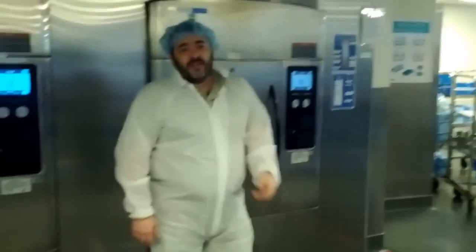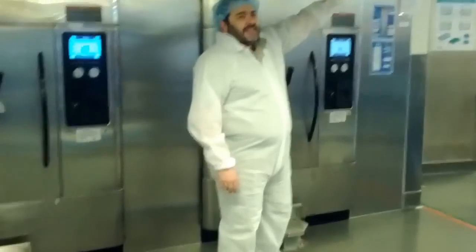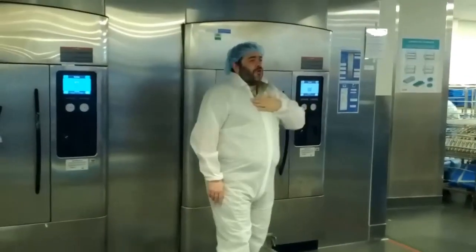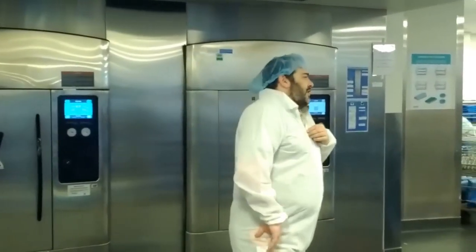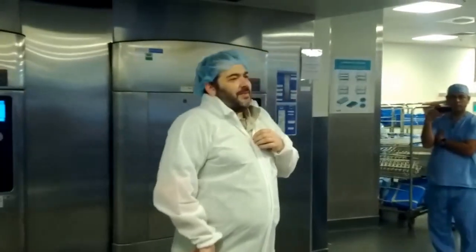In the steam sterilization area, same air pressure, same cycles as the prep and pack area is concerned. As you recall from our lectures, we have several different types of steam sterilizers: gravity air displacement sterilizers, usually the domain of tabletop sterilizers, okay? And dynamic air displacement sterilizers.